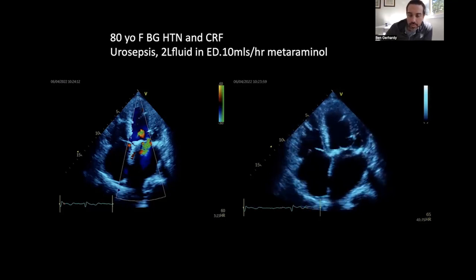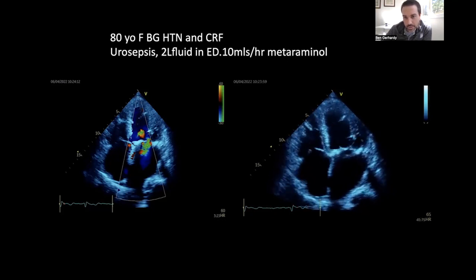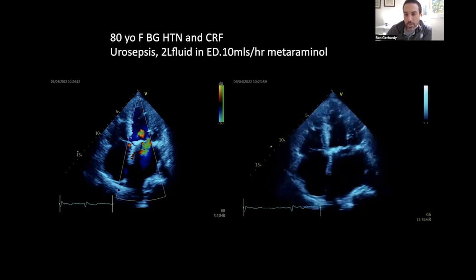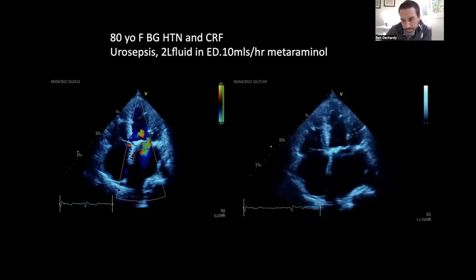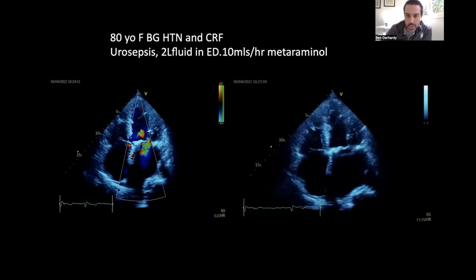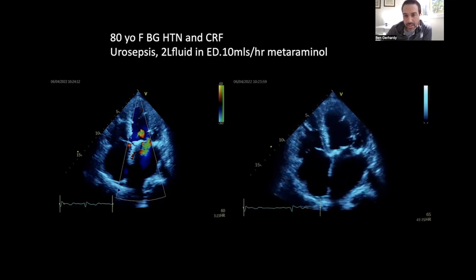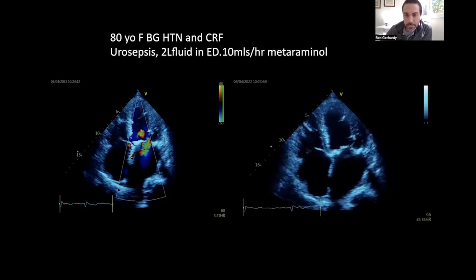All right, so the concerning things on this apical 4-chamber are severe biatrial dilation with fixed interatrial septum bowing to the left. There's thickening of the left ventricular myocardium, trabeculation of the right ventricle, reduced mitral valve opening, and probably a fixed posterior mitral valve leaflet. So she's likely got mitral regurgitation. She's got some structural heart dysfunction, and I expect diastolic dysfunction. Her right ventricular contractile function longitudinally is probably reasonable, but given it's dilated at the annulus, she's going to have some tricuspid regurgitation as well.